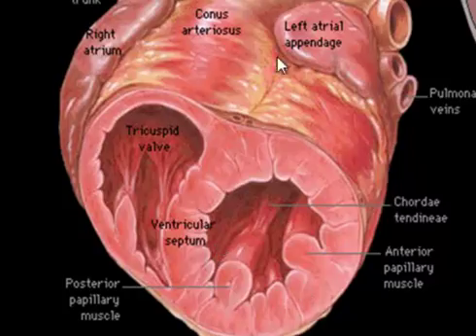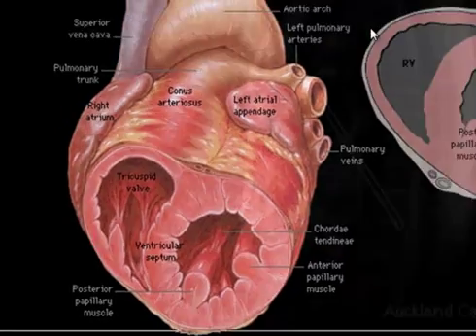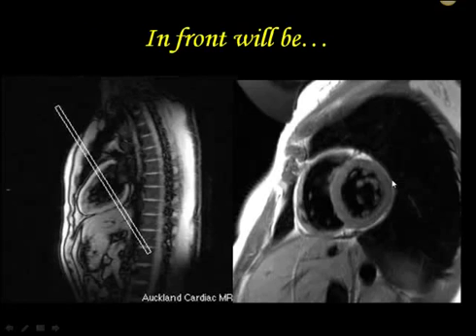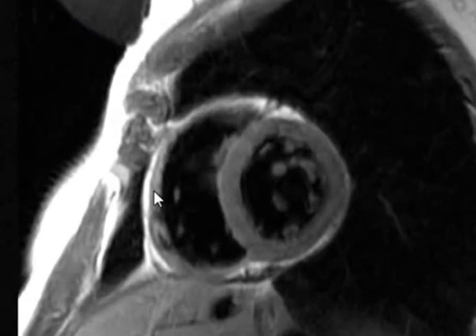Now notice this is the anterior surface. That means over in here. This is the anterior surface. Remember that. That's one reason why it looks a little cattywampus. And this is the way the angle is actually set up. So as you can imagine, it's not going to look like something you typically see daily. And when you look at it from an MRI perspective, this is actually demonstrating it in part.